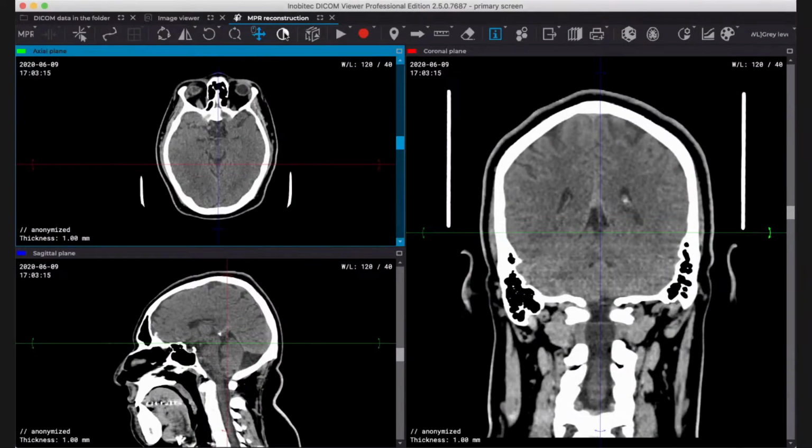Also, I'm going to select this one for rotation because it's the one that is better for me for 3D modeling. But you can also do it, for example, for window leveling. And you see now I am just clicking my right button up and down, and I'm modifying the window level, okay? So this is a very nice feature.